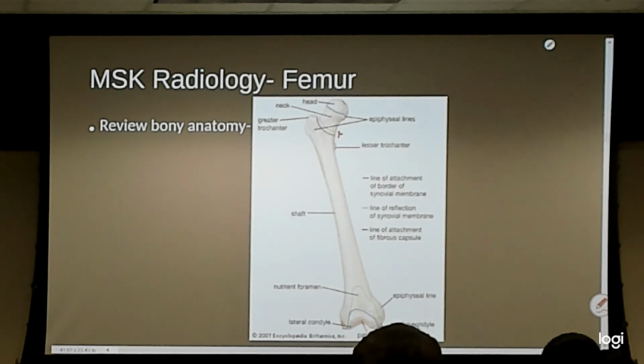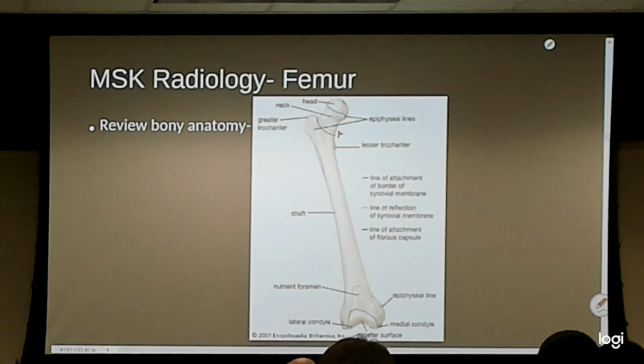Cartilage goes up that entire green line. That's all behind the patella. And that is cartilage that we need to look at when we start considering patellar pathology and what's going on behind the kneecap. Let's see here. Medial lateral condyles. Yeah, pretty good with that.